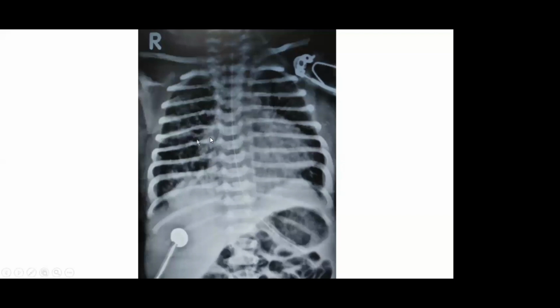It could be any lung pathology, any parenchymal pathology. The ribs have become straighter, so it's more or less an oblique view. It could be a bacterial pneumonia, a viral pneumonia, or MAS. It could be anything. But in the absence of clinical details, try to read X-rays with findings, not with a pathological or bacterial diagnosis.